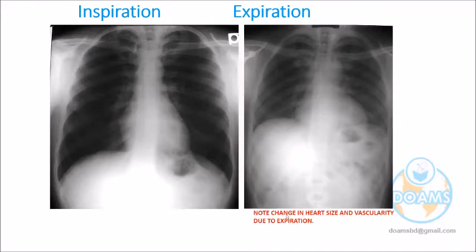So when the film is taken in expiration, some abnormalities become visible. The heart shadow seems to be bigger, and there is increased vascularity due to expiration, with an extra vascular appearance. Sometimes it confuses us. So whether the film is taken after inspiration or expiration should be known, but there is a tradition for the chest X-ray. When we write chest X-ray, even if you don't mention it, we have to think that the film was taken in posterior anterior view, and after inspiration.